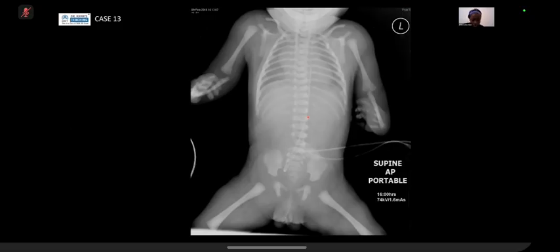And you can see here at the sacrum that there's abnormality at S3, 4, and 5. So you've got what looks like S4 fused to S3 with only half the vertebral body present at S4. So it's probably a hemivertebra that's fused to S3. Anorectal malformations are also associated, so that's the A in VACTERL, and that's often diagnosed clinically by the surgical team or the neonatal team when they do their baby check. And then C is for cardiac, so we can look to see if the heart appears enlarged, suggesting that it might be an underlying congenital abnormality.